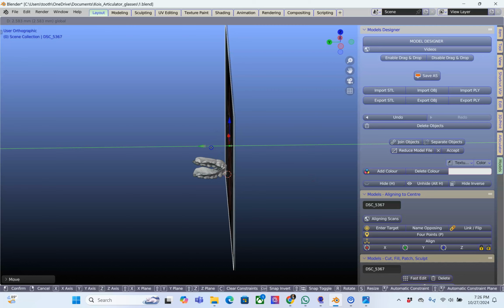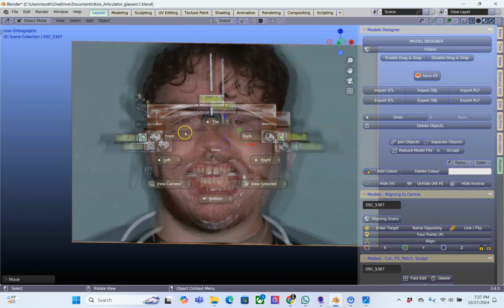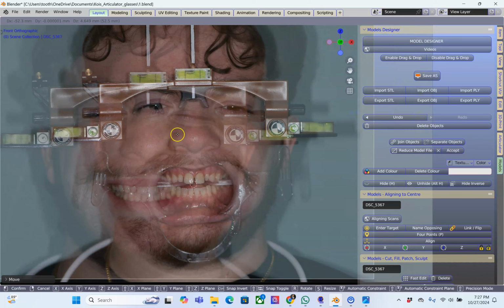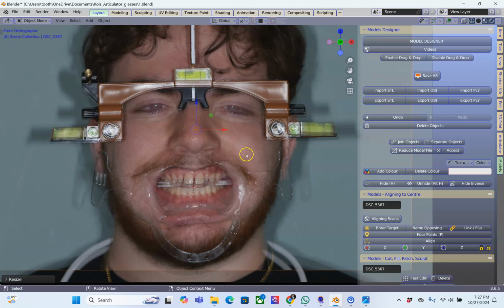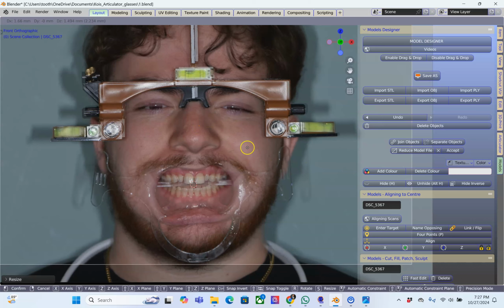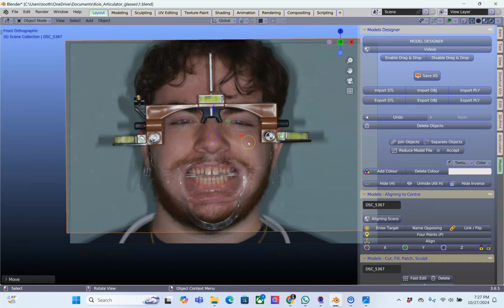Now if you put it behind it, we were able to see the two of them. So here, tilde key for front view, G key, we can see it over here. I'm going to go according to the top structure, so I'm going to place it according to that, and we're going to scale it as well. So I'm going to use the S key. It gives me a very good reference point of how to scale it like that. It's very quick to do. Maybe we can rotate it a little bit as well. R to rotate and G to grab. Okay, that's a very good reference point.